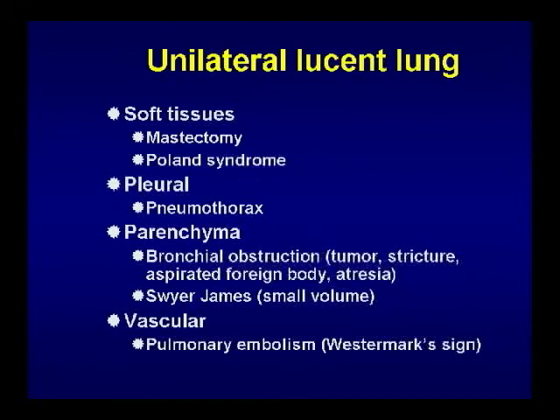Never forget pneumothorax. It's not unreasonable to mention it. Sometimes you don't see the pleural line. I would consider pneumothorax. If there's a concern for that in chest pain, you may want to get a decubitus view.